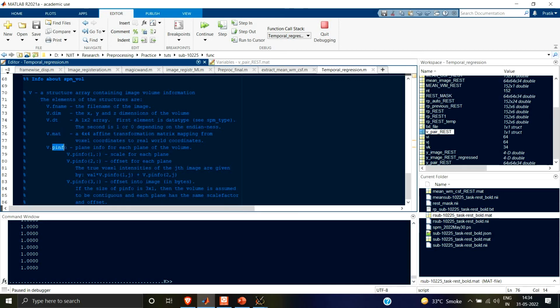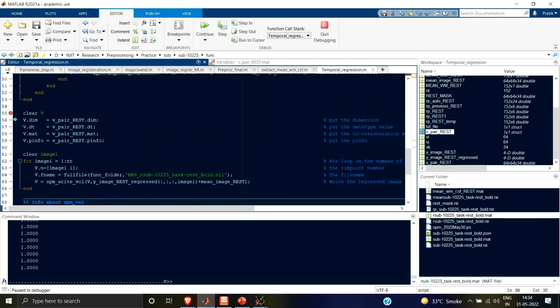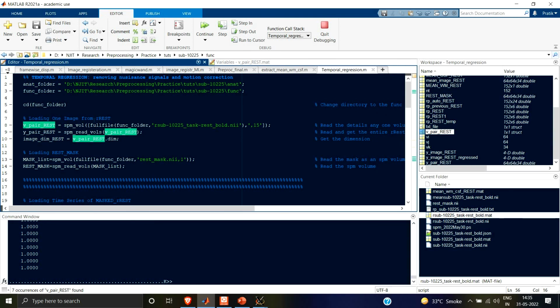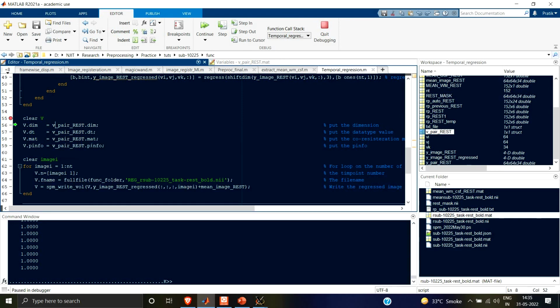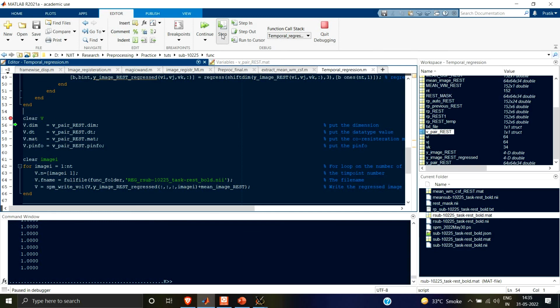And there is something known as plain info. You can read about it over here. Okay, so these are the important header files that we require, and this was where I created. So in the start of the video I told you to just choose any one image. So this is 15. I mean, this can be anything, you can do it one as well. So take any volume and copy the data, header data from that volume to over here, so that the header is consistent throughout. Okay, So here I am putting all the header info.